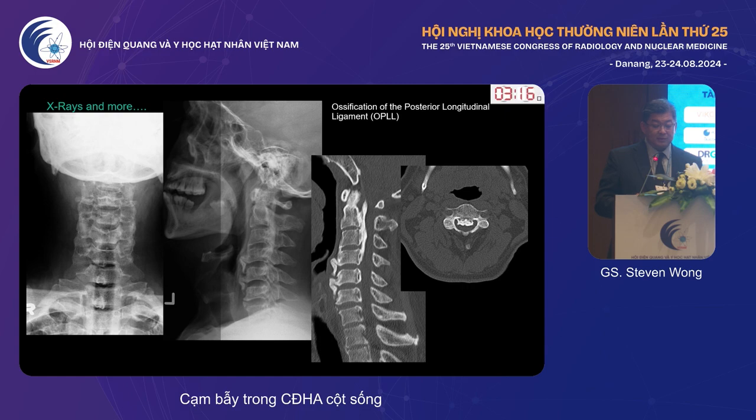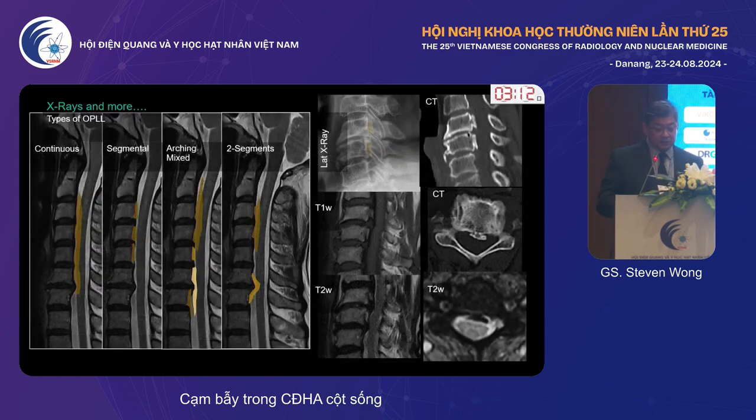OPLL is simple. Get a CT scan, look at it. The degree of OPLL is well reported. MR may actually underestimate the degree of stenosis of the spinal canal. And then there are different sorts of OPLL, each with its own complexities and complications.